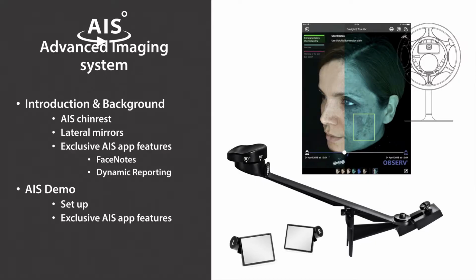We will now move on to the introduction of the Advanced Imaging System. The Advanced Imaging System, or the AIS, is an add-on system for the OBSERV 520 and allows you to get more out of your OBSERV. The AIS includes a high-quality chin rest, a set of lateral mirrors, and provides access to the AIS exclusive app features, the FaceNotes and Dynamic Reporting, which we will discuss later on during the demonstration.